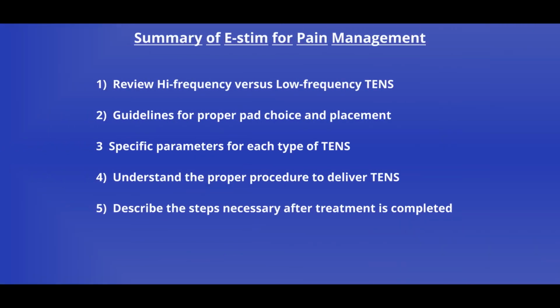So hopefully now you have a better idea of the difference between high frequency and low frequency TENS, a basic understanding of pad placement and parameters to be used, and an understanding of how to perform TENS treatment and what to look for after treatment is concluded.